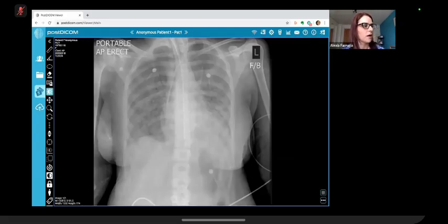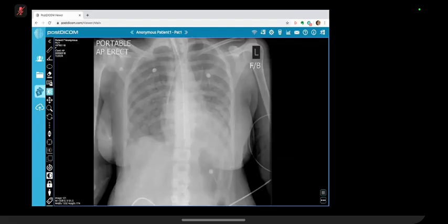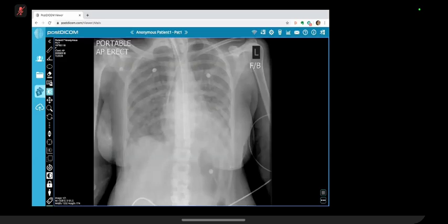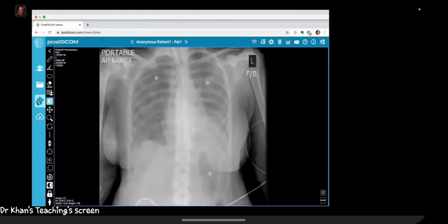34-year-old lady with previous cardiac and renal transplants. Okay, so this is a chest X-ray in an adult patient, which demonstrates diffuse abnormality of both lungs. There is very high ground glass opacification involving both hemithoraces. There's no loss of volume. The costophrenic angles are slightly obscured. However, no frank pleural effusion. The heart size cannot really be assessed on an AP film. Don't see any bony involvement.